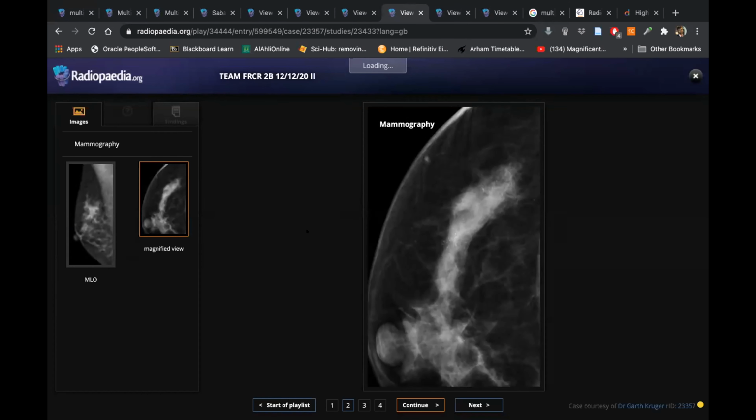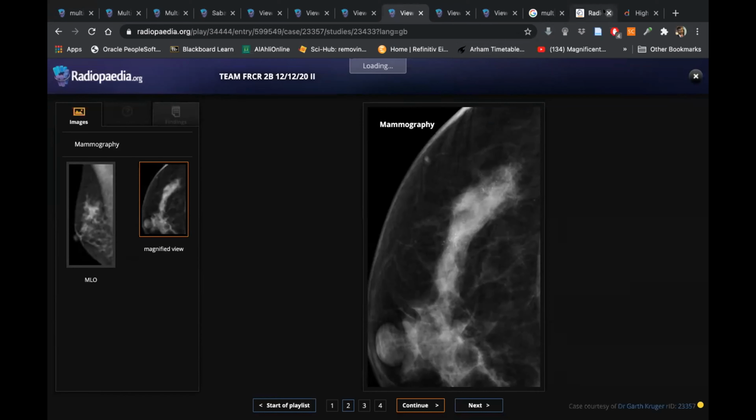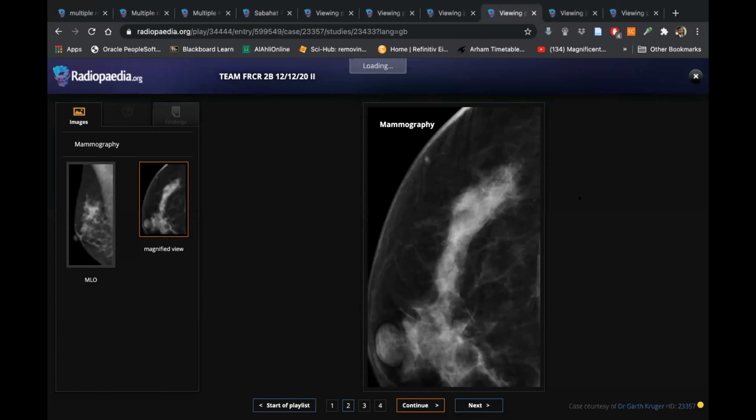However, as the amorphous calcifications are noted, these are worrisome, and I would look at the patient with ultrasound to see if I can find anything. Otherwise, I will refer the patient to the breast surgeon and the interventional radiologist for the stereotactic biopsy and the triple assessment.